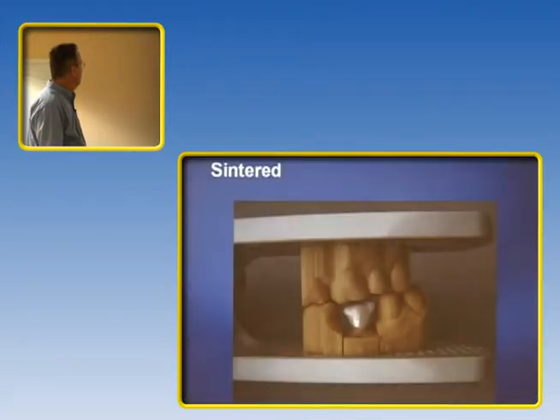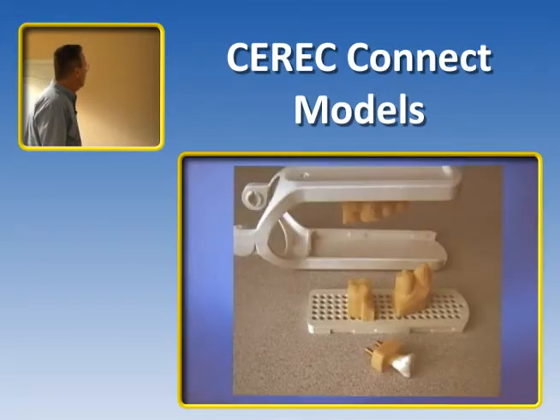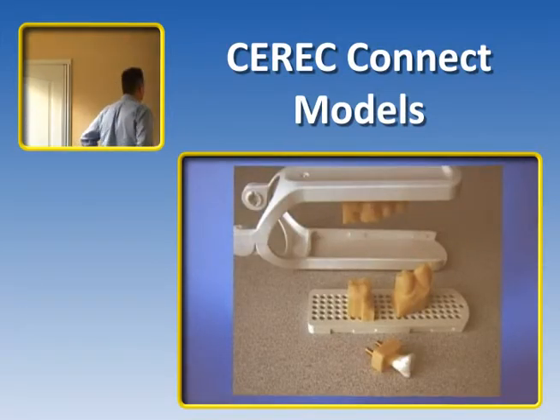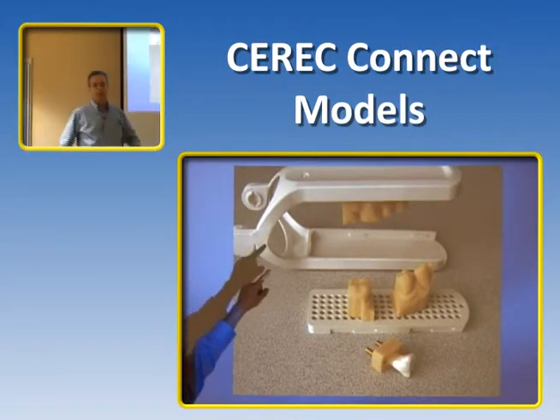Here I've completed the coping. We've got the model back in the laboratory. This is how the model ends up coming apart. Now, this articulator is a reusable articulator.